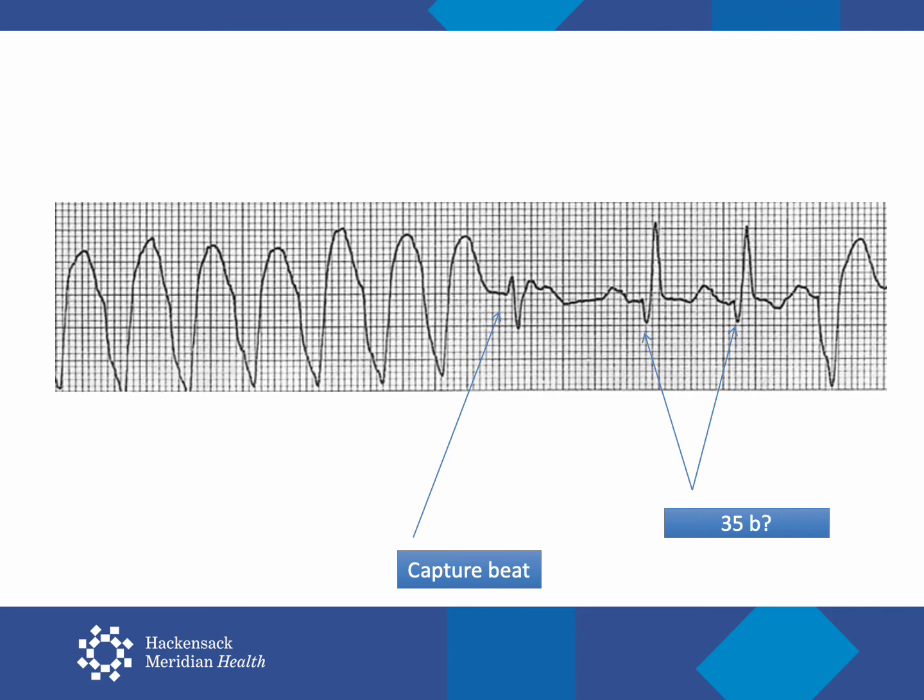Here, for example, notice that there's a normal QRS among the wide complexes. This is a capture beat, and it indicates that the wide complexes are of ventricular origin and not supraventricular with aberrancy, as a sinus beat is not aberrantly conducted. Here you additionally see two beats which are in a sense combinations of the sinus beat, made wider or more atypical. These are called fusion beats.